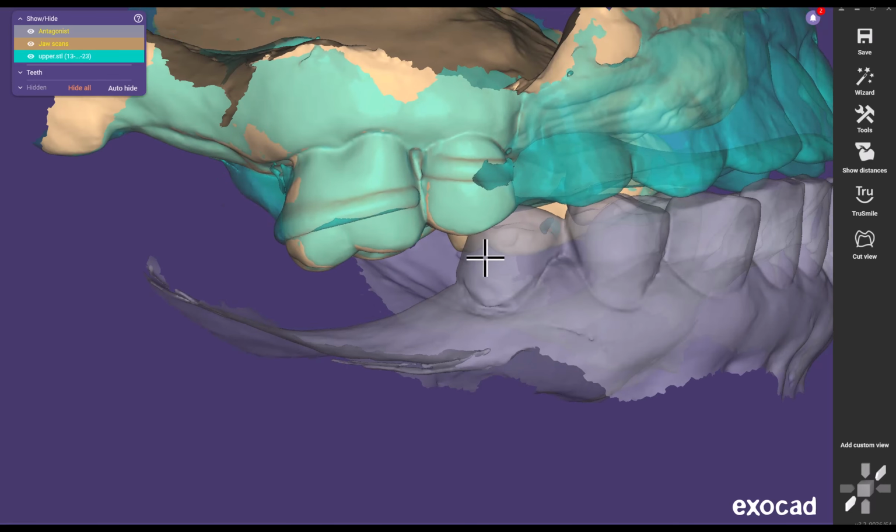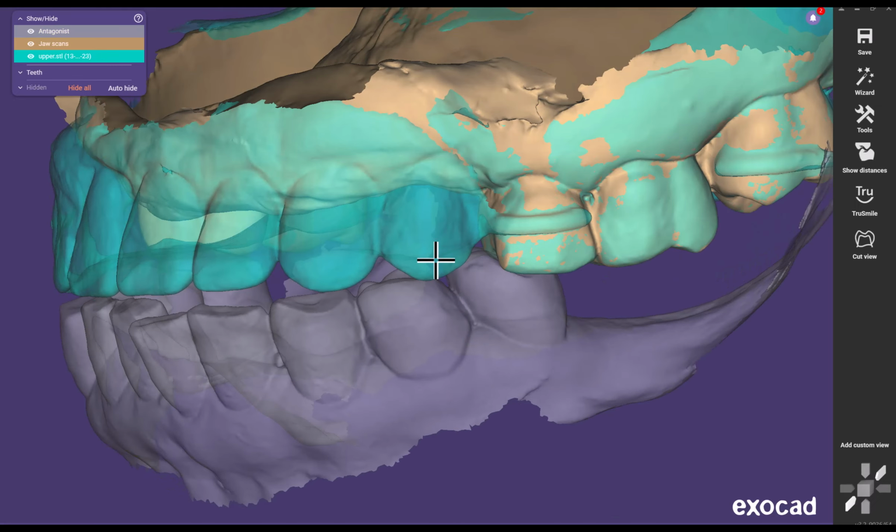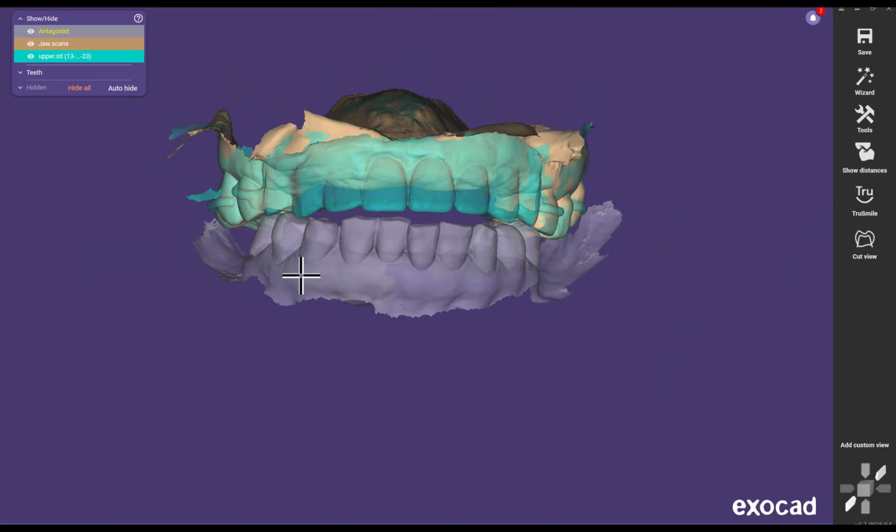You know, the patient's only got these 2 teeth that they're biting against, and so they might just be pushing forward just to create the ability to get some teeth together. I don't know, since I didn't capture this data, if it's eccentric, but we might ultimately have to redo this for the prosthetic with a good centric bite, because we need that to be dead on and centric. But for our purposes right now, we'll go ahead with this.